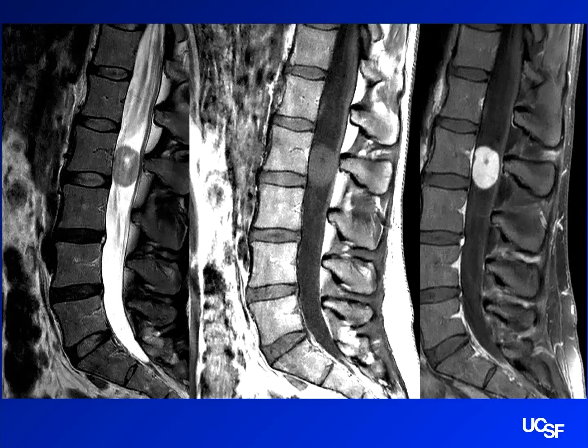No. Now that I can see a little, maybe it looks like it's displacing the cord. I can see that on the T2. So this is kind of tricky because I think you're getting some flow artifacts here. But the conus is somewhere up here. So the only point I was trying to make is that you can't have an intramedullary lesion that's below where the cord stops. Okay. And you didn't really know that because I didn't really tell you, so that's not very fair. I do think the nerve roots are displaced to either side.